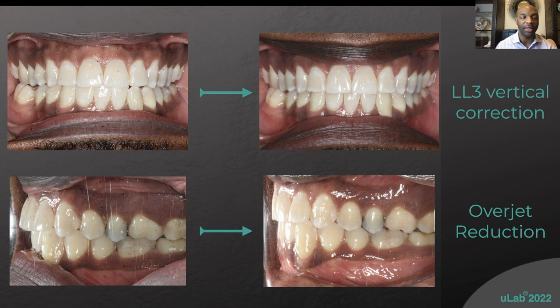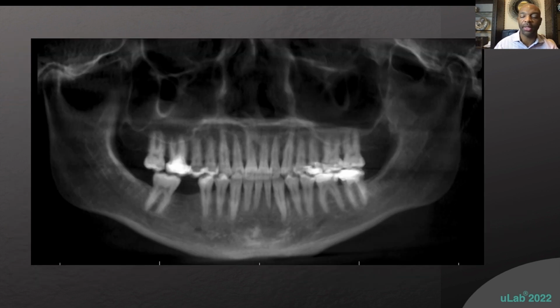And then also you can see the overjet correction that I had by, I think I did a little hand stripping up top and just tucked those upper incisors back a little bit just to give us a little better coupling in the anterior. So the goals were achieved. Again, patient happy, I'm happy. And I think we were able to give him a good result.